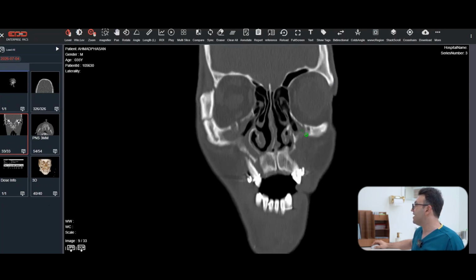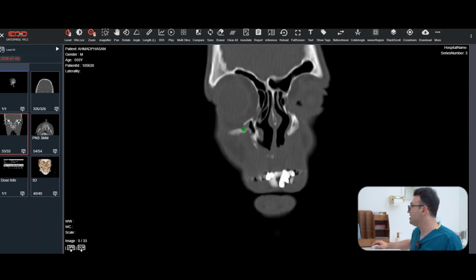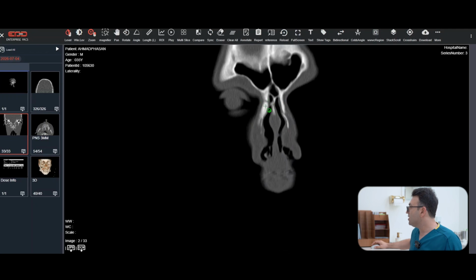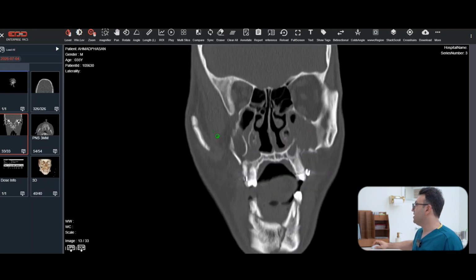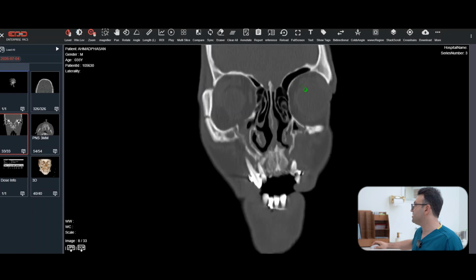I see the fracture on the inferior rim of the orbits on both sides, and also the nasal bones on both sides. So that shows the Le Fort 2 fracture. That patient has Le Fort 1 and Le Fort 2 fractures simultaneously. Again, I will complete that. I see the fracture of the zygoma on the right side, the lateral wall of the orbits, especially the zygomaticofrontal sutures.